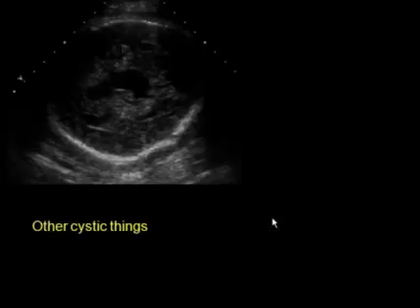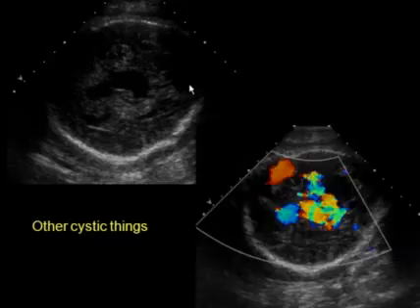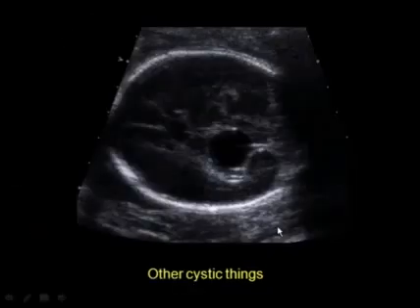Remember that everything cystic in the brain is not a normal variant. In this case, we have an irregular fluid collection that's right in the midline, but has a curved shape to it and possibly some extensions out of this shape. And don't forget to turn on the color Doppler in this instance, because we see that this is a large vein of Galen aneurysm. Another cystic thing in the brain is this round structure here. It is not in the midline. It's off-center on one side. It's posteriorly and related to the tentorium, seen underneath the temporal occipital lobe region here, and this is an arachnoid cyst.